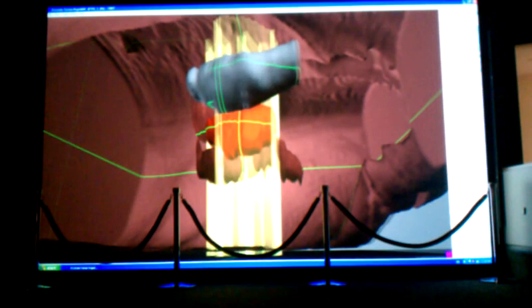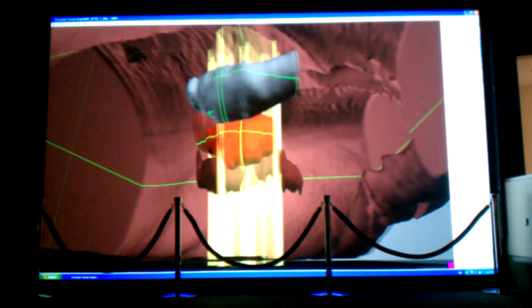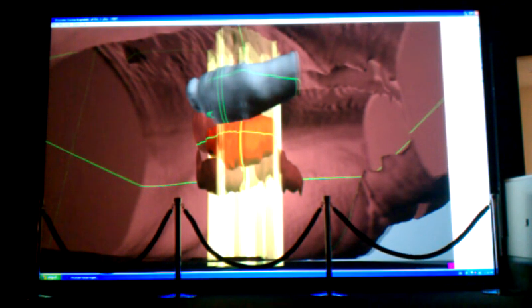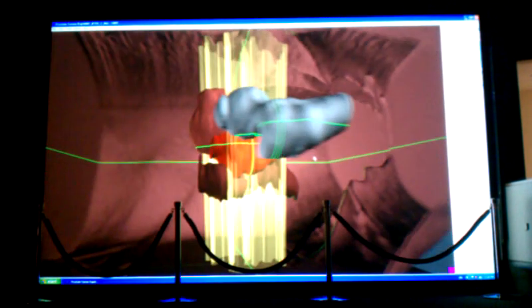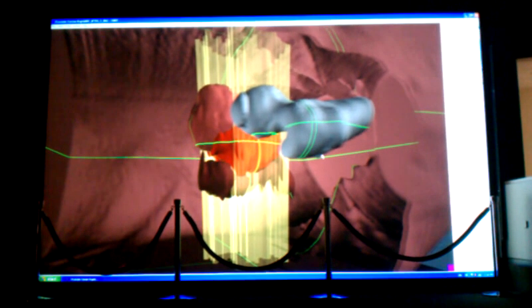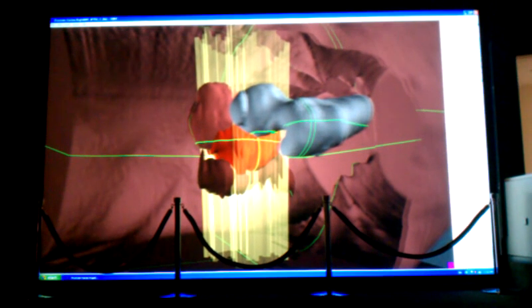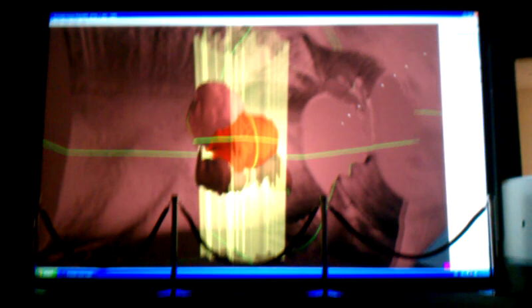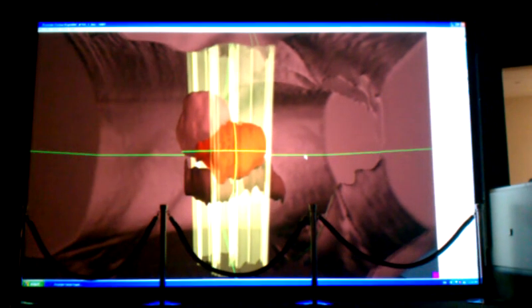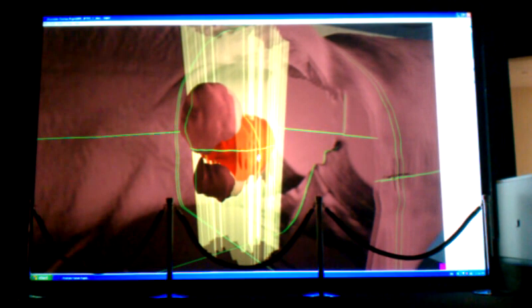And while she's creating the set of errors, this is probably one of the biggest flaws of the system. When the therapists are working with the patient, they have to physically touch the patient and move the patient. Because these patients are in a virtual environment and we don't have gloves and all that kind of stuff, we can't do that. But what we can do is rotate the patient, we can change the pitch of the patient, but we do it electronically on the scale. And then the students have to move them that way.